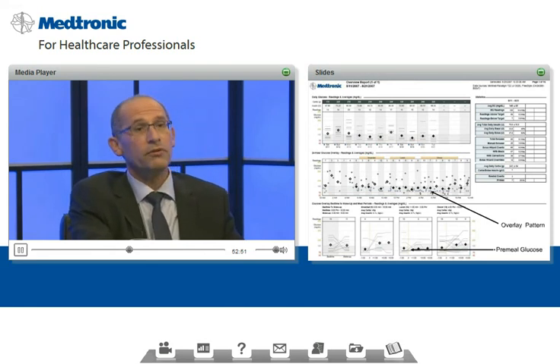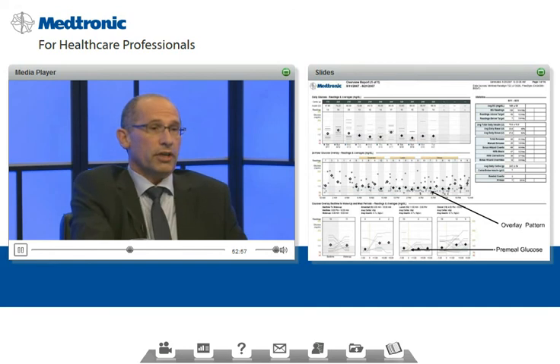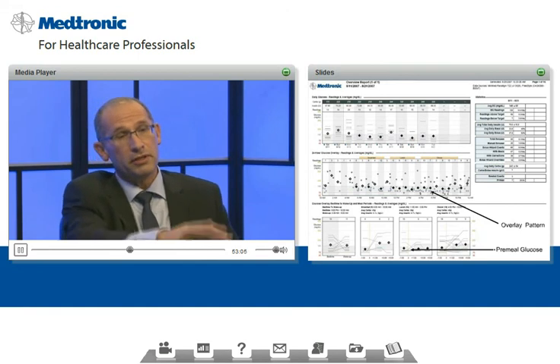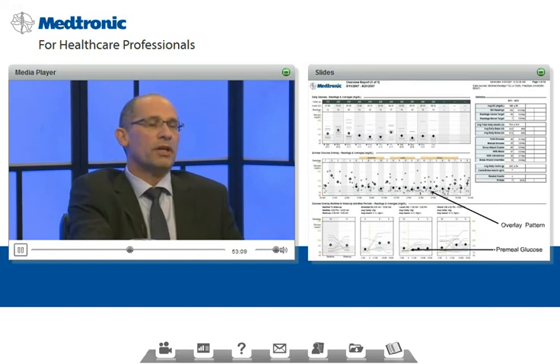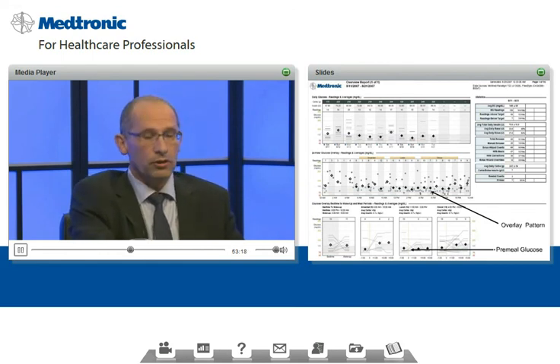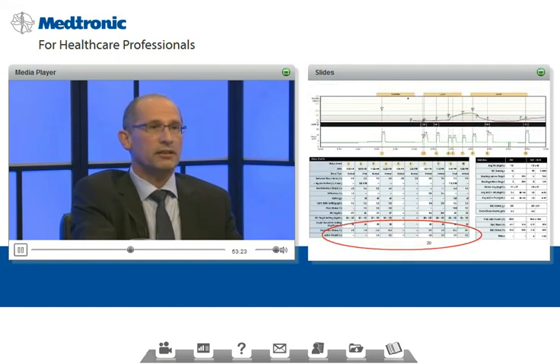Again, you do have also data regarding the meal data on the bottom boxes. And the meal data on the bottom boxes show you again that the pre-meal glucose is fine. That means probably the basal rate is not bad during the daytime. But the bolus is inadequate, at least in the morning, to overcome the high blood glucose excursion in the morning. Again, a question of is it adequate basal or is it adequate bolus? This needs to go further on and look at the daily details. We'll come up in a second because the next is the daily details again.